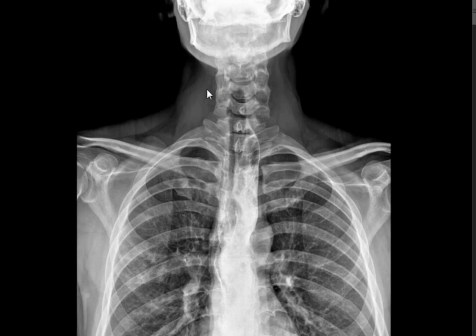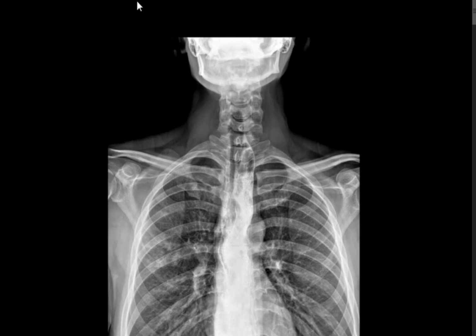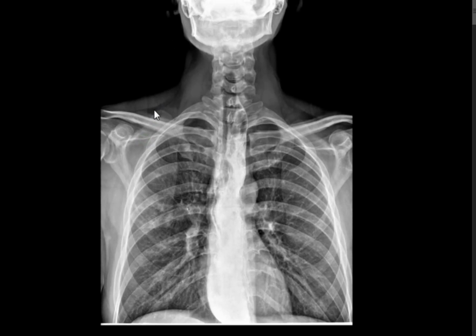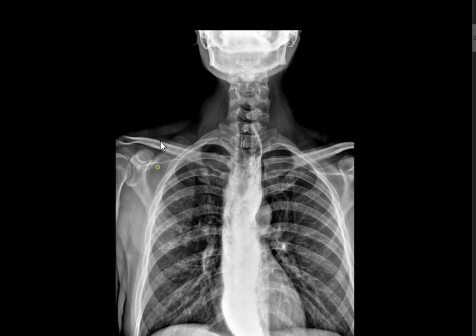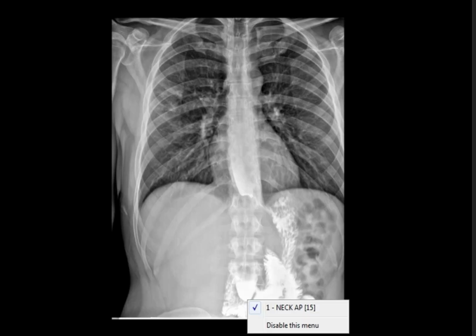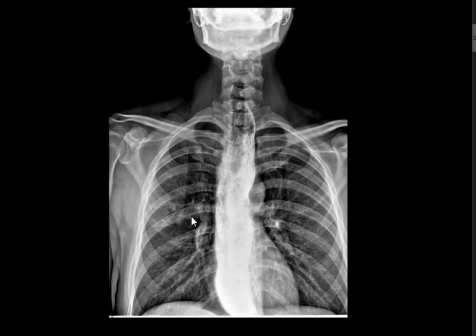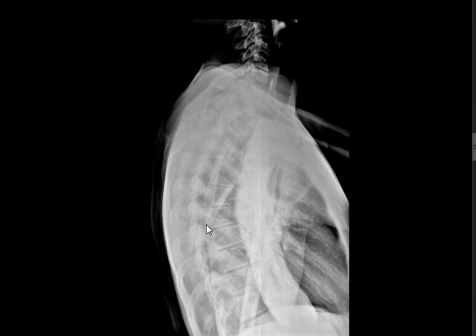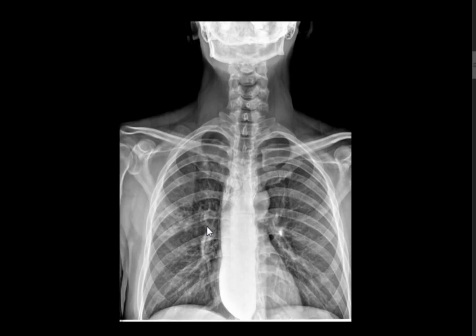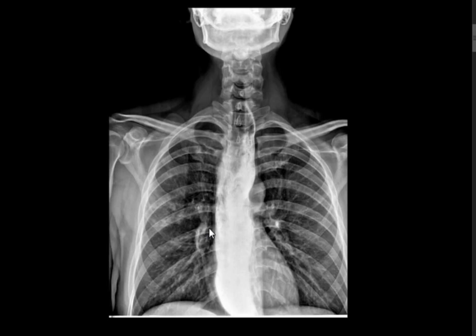A 40-year-old male patient presented with a long history of vomiting and regurgitation and things like that. What is the exam, what do you see, and what would you... Just scroll, don't do anything. What's this exam? Barium swallow. Barium swallow, excellent, showing a dilated esophagus.